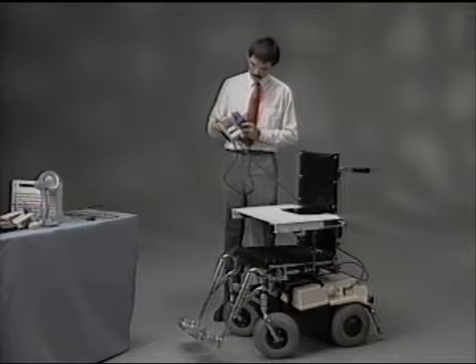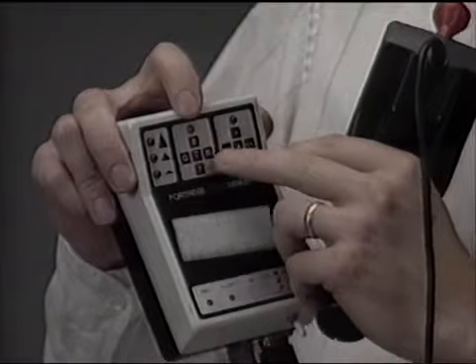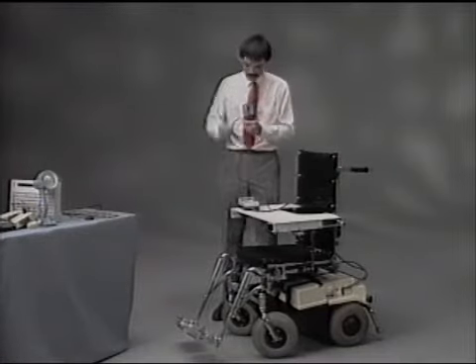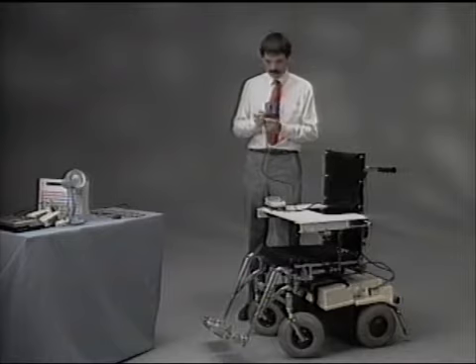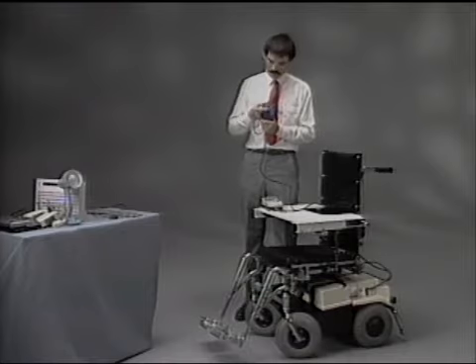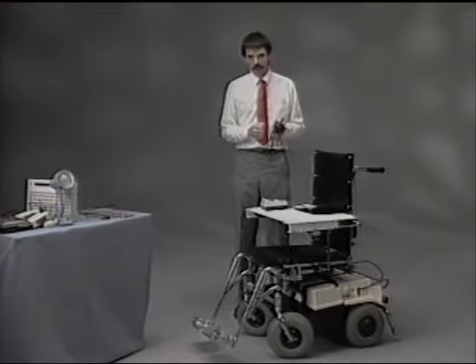I can scan by holding the fire button down to the center section here, which has a letter for each direction of the joystick: B, R, G, and Y. B is in the forward position, and if I push the joystick forward, I can turn on the light, and if I push it forward again, I can turn off the light. The same thing with our small handheld joystick. If I push it in the left position, I can turn on the cassette tape and turn the light on and turn the two off. So now our power wheelchair is not only getting us around our environment, but allows me to turn things on and off in my environment.